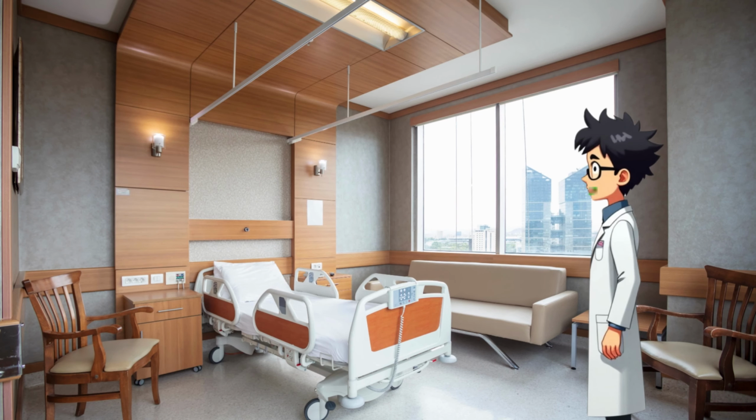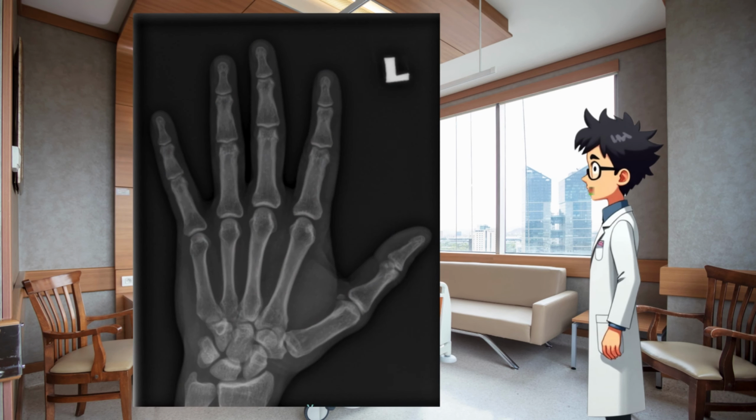Let's begin with radiographic anatomy. A strong understanding of anatomical structures is one of the fundamental skills required to become a competent radiographer. The image shown highlights several key features visible in the hand's postero-anterior projection. As radiographers, we should be able to recognize the phalanges, all the joints, metacarpal bones, and the carpal bones clearly on the radiograph.